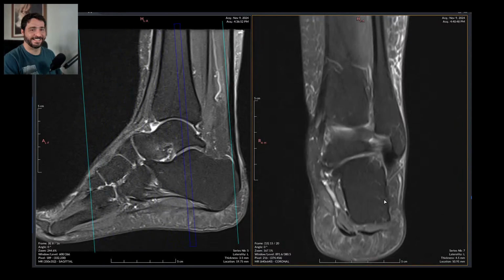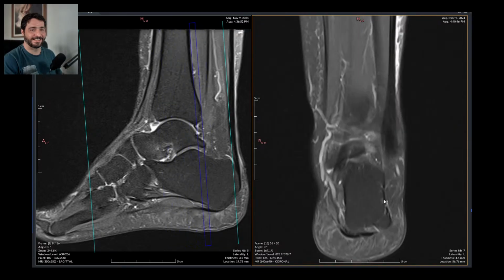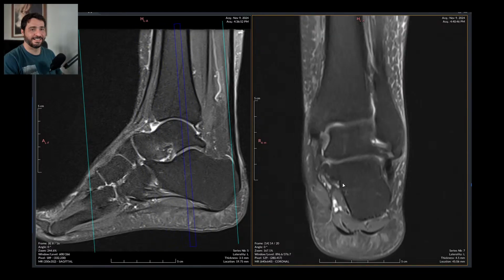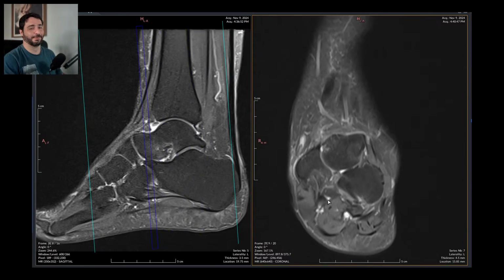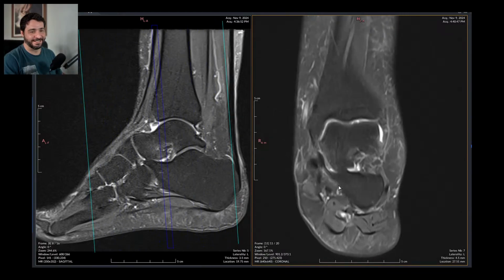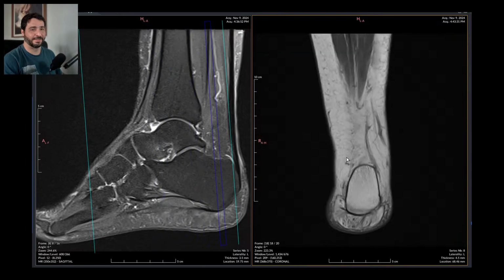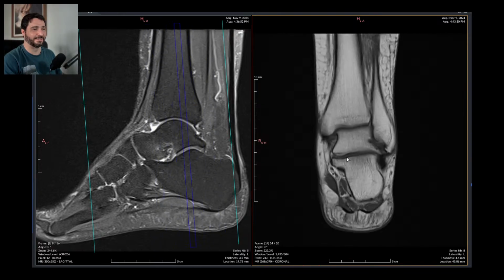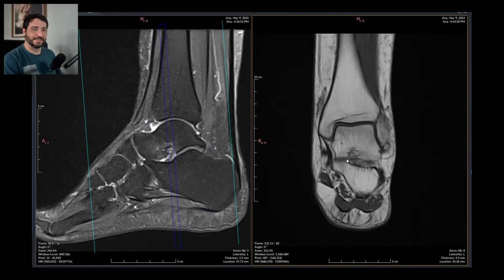They just want to go through it without making anything of use in this sequence. See, this is just stupid. Come on, you can't just do a 4.5 thickness coronal ankle exam. This is just, oh crap, this is just freaking terrible. Come on. Oh boy.